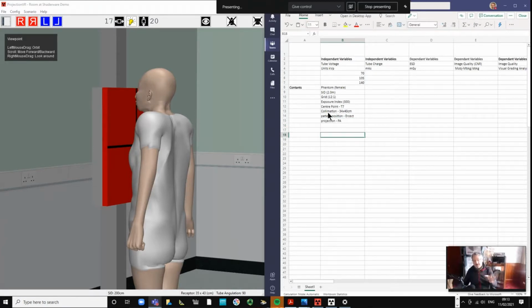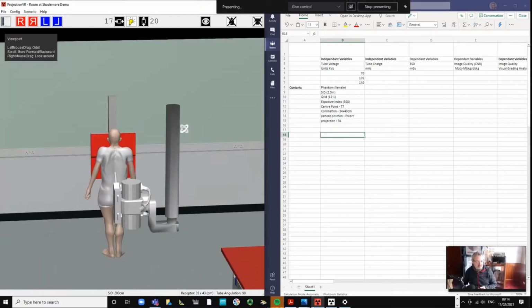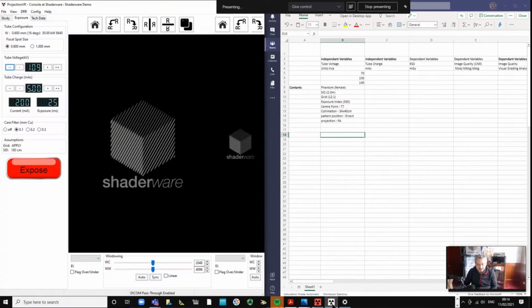Okay, so we can criticize any paper that doesn't have all this information, so that if we're having to guess, then we may get it wrong, won't we? So T7, that's fine. Right, that's good. You all with me? Yeah.